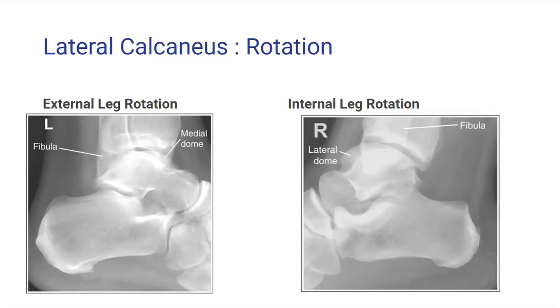Again, let's take a look at how we identify rotation. As we discussed in the lateral foot projection, the same anatomic alignments are essential for accurate lateral calcaneus positioning.